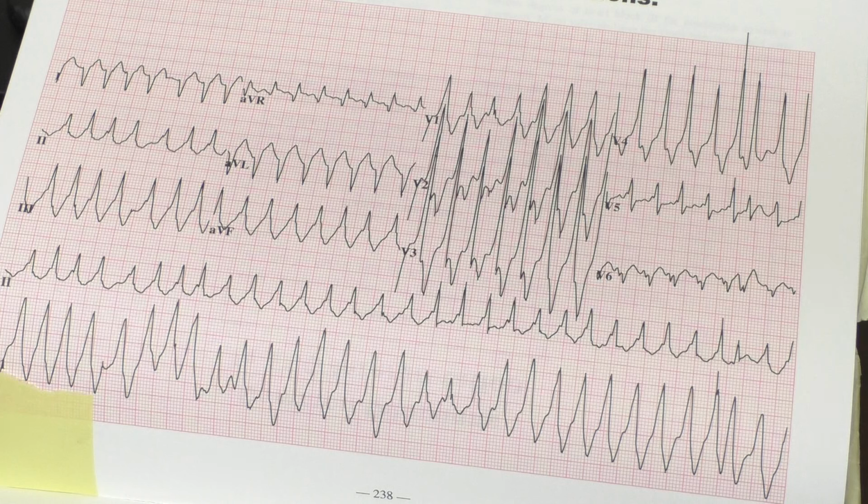So typically, if you saw this person in the ER, what would you do, James? I mean, how much diltiazem do you want to give him? We said AFib, all right, first drug in the ER is usually diltiazem. How much would you give? You remember what we said the other day?